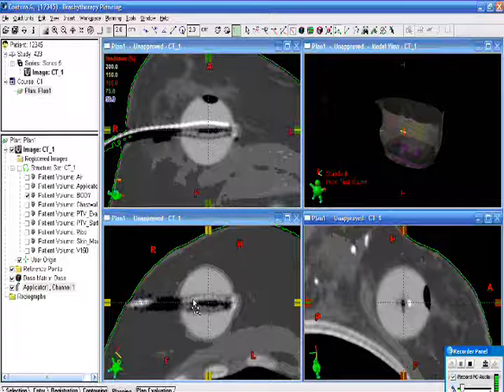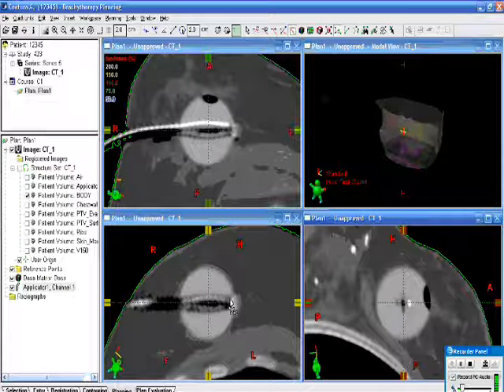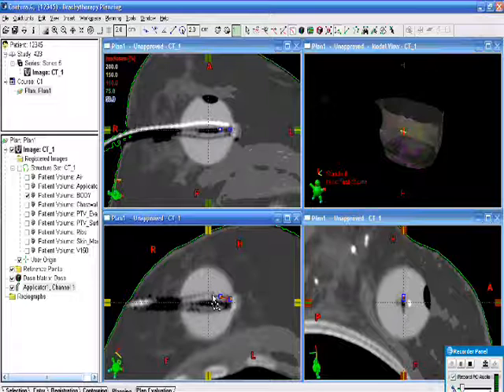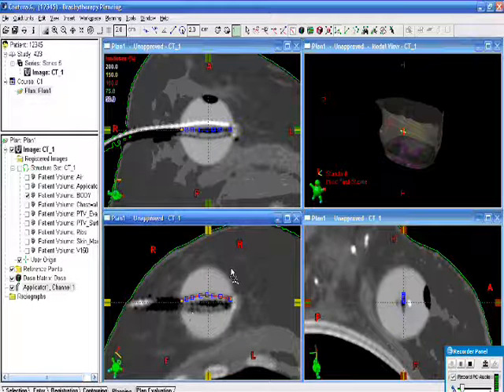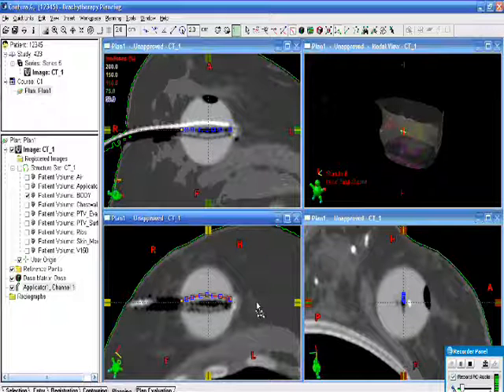And because we know this nitinol wire is underneath the channel, we're going to try and reconstruct along the darkest part here, which is the center of the air column. So channel 1 we will reconstruct just like this from a template, and have it exactly perfect when you do that. But I'm going to illustrate that my way, which is to reconstruct them every time.